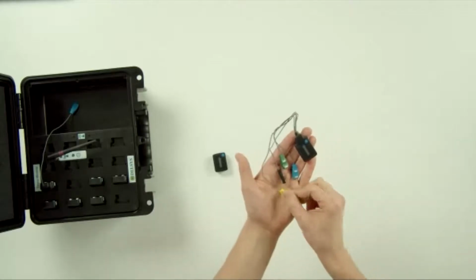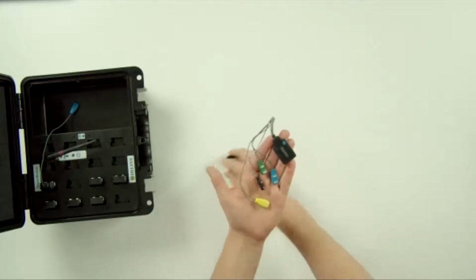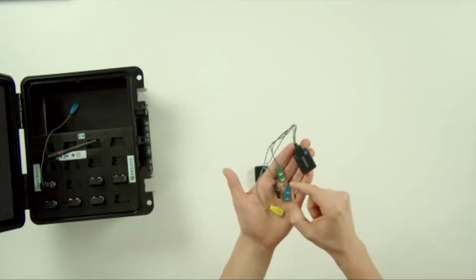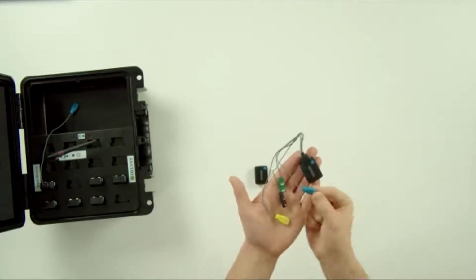But in this case, we have these miniature heads to collect EMG data. The inter-electrode spacing is still the same as the Avanti at 10 millimeters, but it offers users a different method to collect EMG because of its smaller head and its lightweight, low-profile nature.